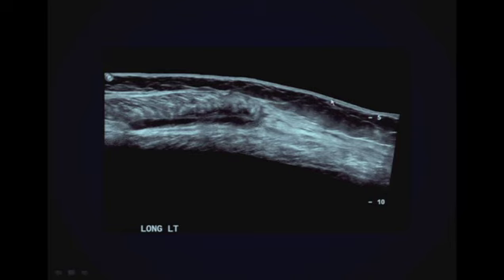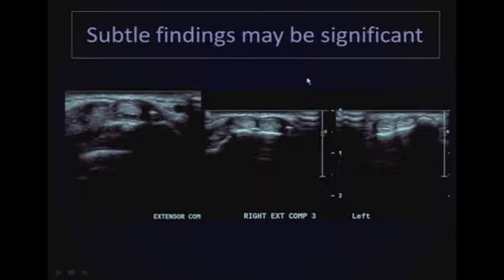Many times people will call this a hematoma in the calf, but now that we have a panoramic view, we know that this is the expected location of the plantaris tendon. It lies deep to the gastrocnemius and superficial to the soleus. Classic location. Knowledge of history is very important. Talking to the patient is very important. And again, this panoramic view is also very useful because you can see that there's a plantaris tendon rupture. Not only that, the muscle fibers of the gastrocnemius are disrupted. So this patient not only had a plantaris tendon rupture, but also a gastrocnemius muscle tear as a source of her pain.